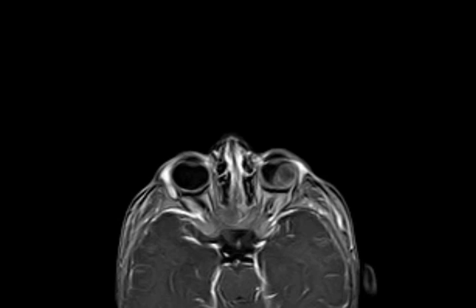So, if this case is a retinoblastoma, what else would you look for? The other eye, to look for bilateral retinoblastoma. And what else? Sella turcica, to look for trilateral retinoblastoma, okay? You'd never say hemangioma in a 3-year-old. That's a fatal mistake.